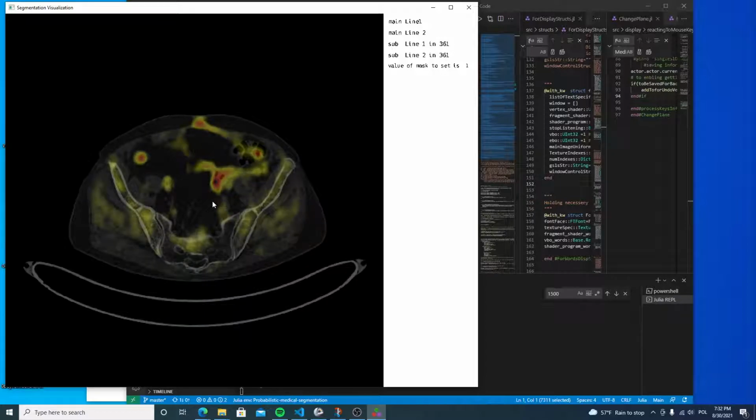I can also change the thresholds. By the thresholds I mean the cutoff values within which the values would be displayed. In case we would be below or above these cutoff values, the pixels would just be set to the maximum or minimum values of the cutoffs.